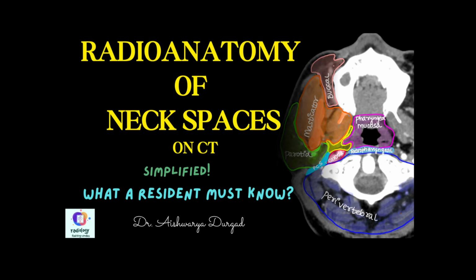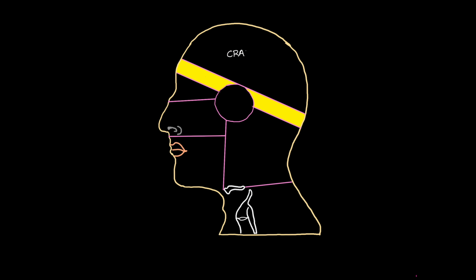In this video, I'll discuss the radioanatomy of neck spaces, especially the deep neck spaces as seen on CT, and this is simplified for residents. Whenever you get a case of head and neck, even in exams or in your day-to-day practice, please feel free to see this video now and then.